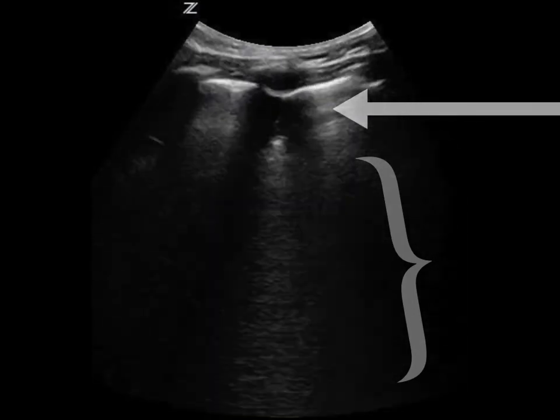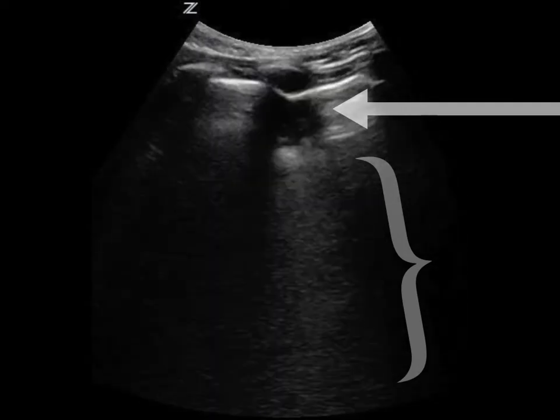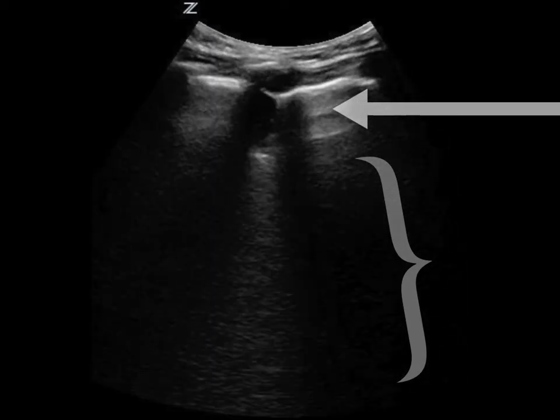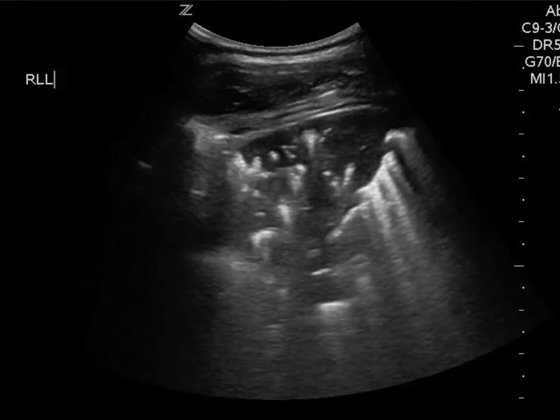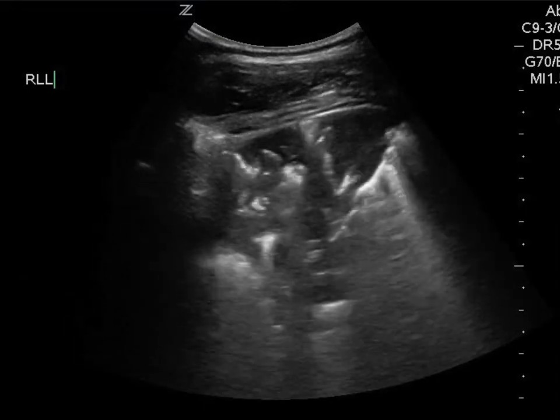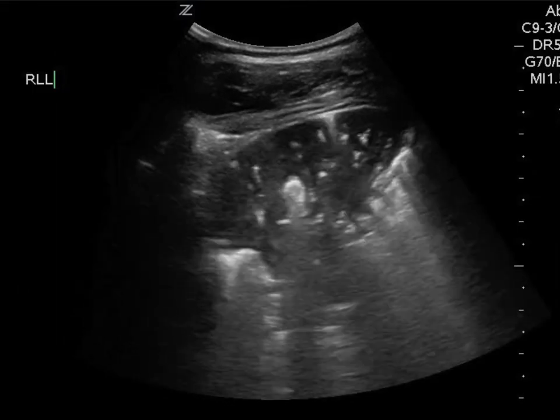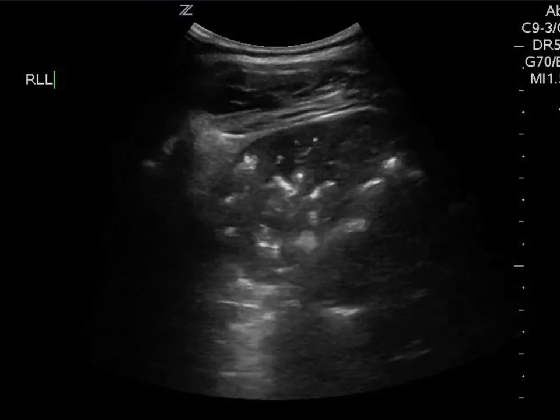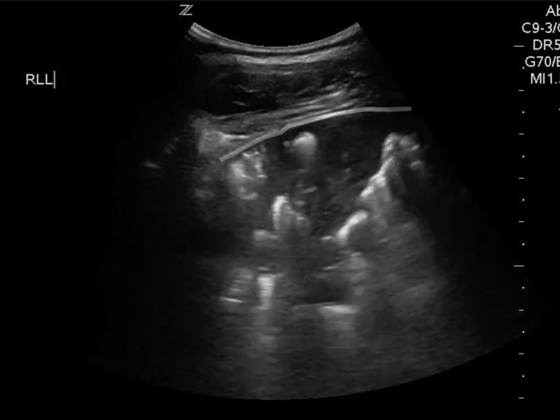Now, let's say that this gets so far gone that this subpleural lesion area, this part that looks like it's scooped out with an ice cream scoop, got a lot bigger. This is what it might look like. Now already you might be saying, well, Dave, I'm not sure what we're looking at. Okay, let's find our landmarks again. We've got skin and subcutaneous tissue. We've got a rib that's just off screen right, and one that we're just partly seeing on screen left, and just deep to them is this pleural line right here.